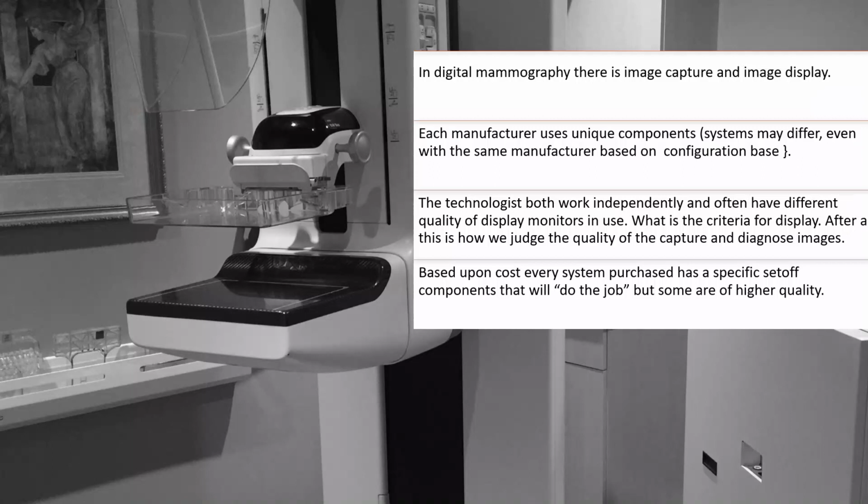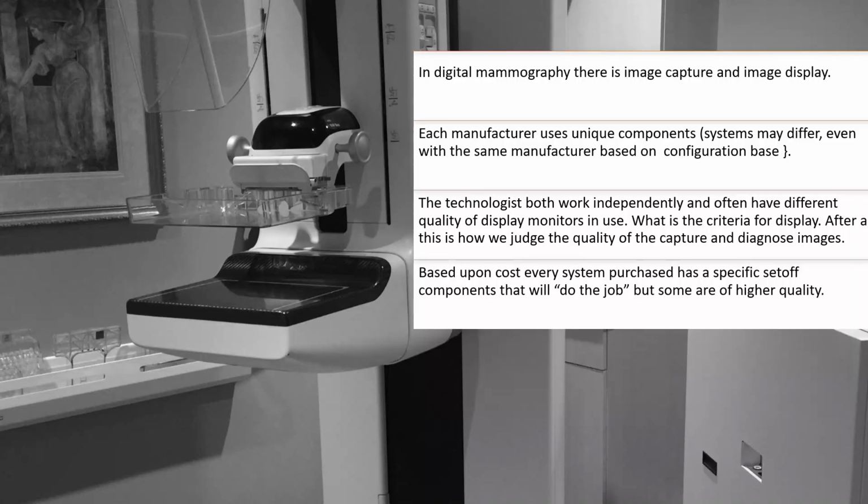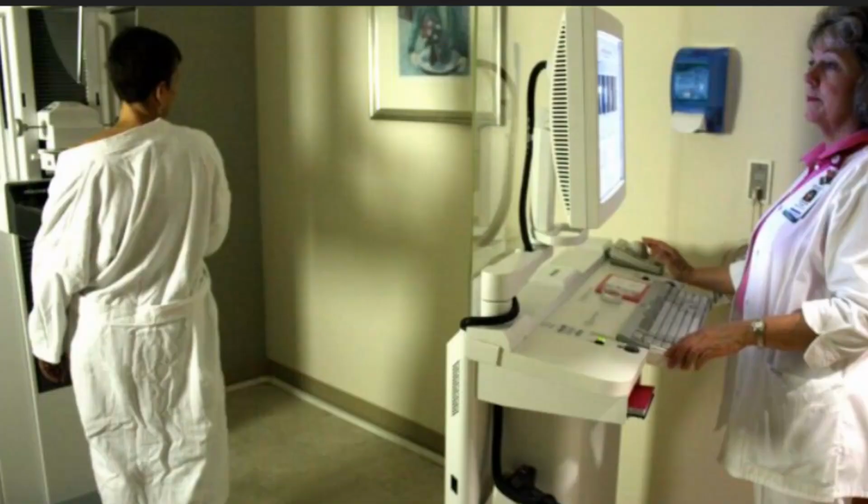In digital mammography, there is image capture and image display. Each manufacturer uses unique components, and systems may differ even within the same manufacturer based on the configuration. The technologists work independently from the radiologist and often have different quality of display monitors in use. So we have to take a look at the quality of the radiologist's monitor and the visual display, and the quality that the equipment has for visual display for the technologist.